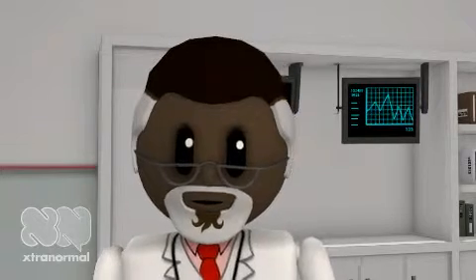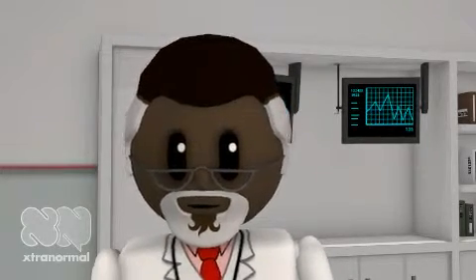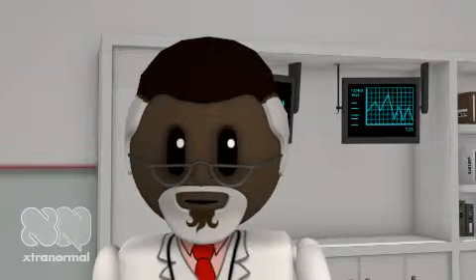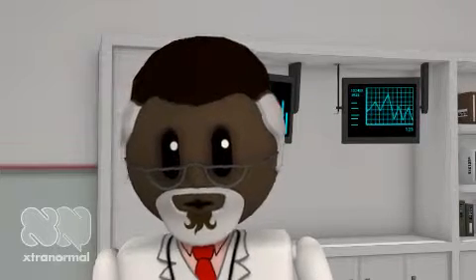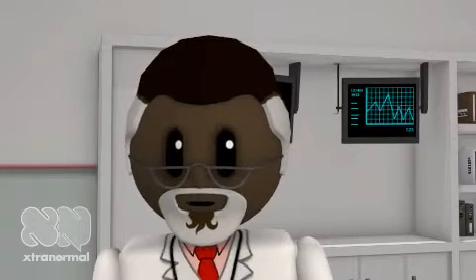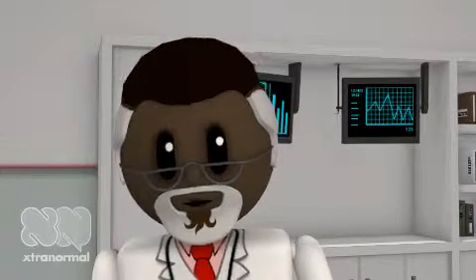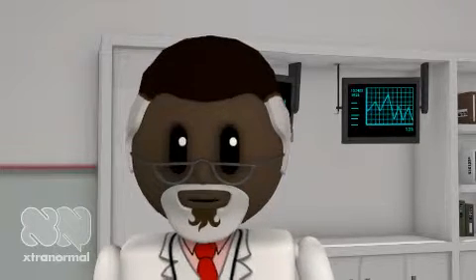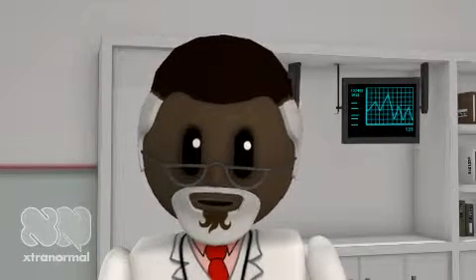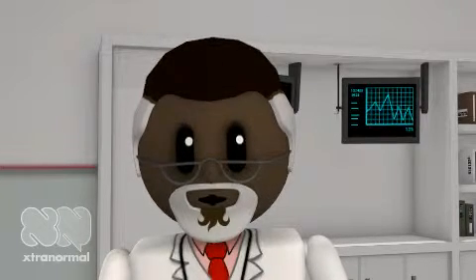Pressure support ventilation (PSV). Flow volume loop illustrates a descending inspiratory flow rate until a system-specific flow is achieved, then the flow rate rapidly decreases to zero. Pressure volume loop illustrates patient triggering. The pressure support breath is delivered with the expiration returning to zero baseline. The loop moves in a clockwise pattern during the initial phase, patient triggering, and counterclockwise for a mechanically delivered pressure support breath.